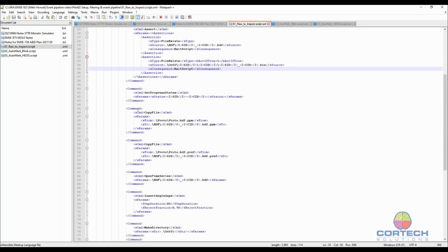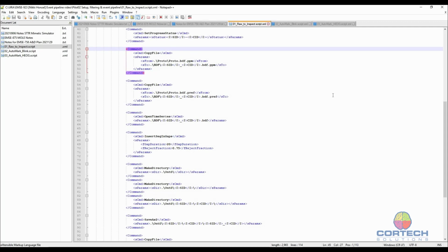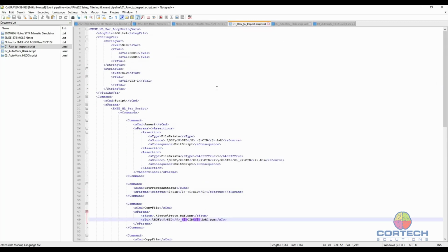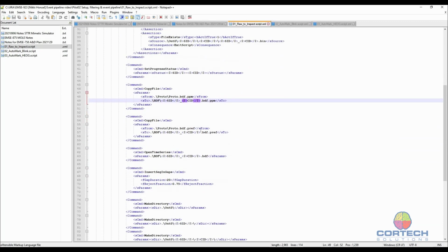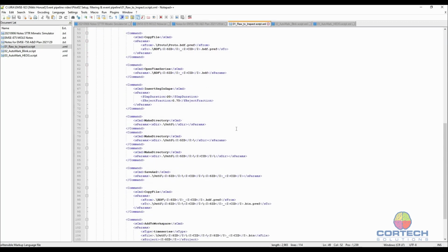And there are other commands here. I think we can go over these in more detail. But notice that mostly, for the most part, these identifiers, the SID and the condition ID, are provided at the top, and then this is just the format of the file name that will get created. And as you'll see, let's go back here.